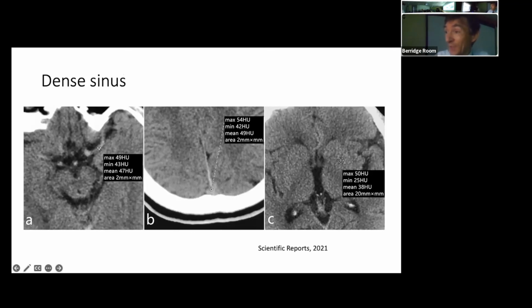Usually in an adult, you can compare the density with the arteries. If they're similar density, that suggests the blood is slightly hemoconcentrated or has an abnormal constituent like fetal hemoglobin.